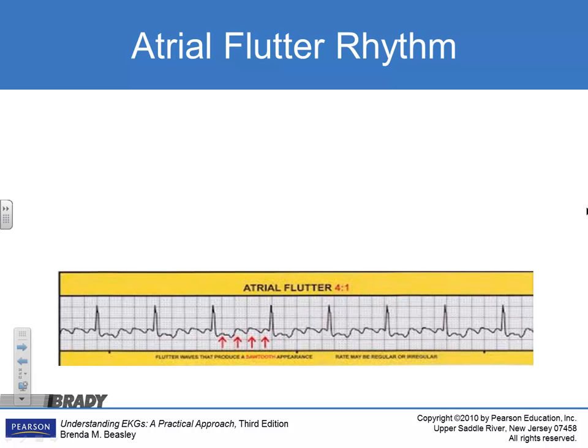Think about it. Did Nick give you all the toilet flushing thing when he described how these things repolarize? Here, you're getting in right the tail of the refractory period, and it hasn't totally repolarized, so you're not going to get a normal looking one there. Okay, so that's a 4-to-1 conduction.